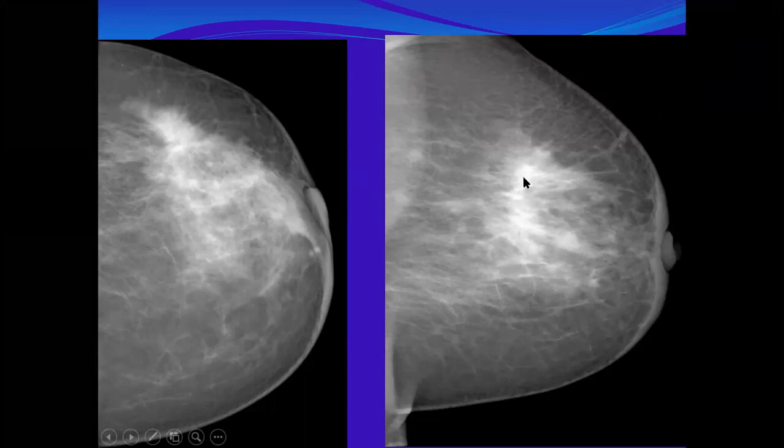But it looks like multifocal. You see, multifocal asymmetry. Yes. Or global asymmetries. Okay. And even if you look here, there is another area. I will go for multifocal associated with distortions. So this might be part of a larger focal asymmetry, and the others are another foci.